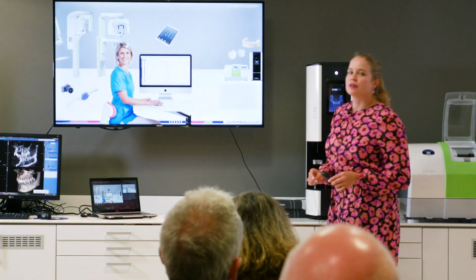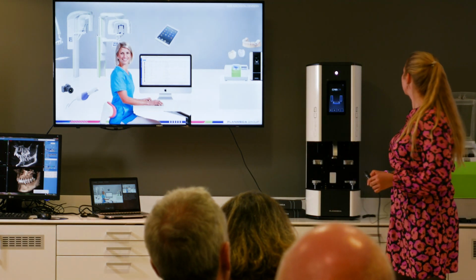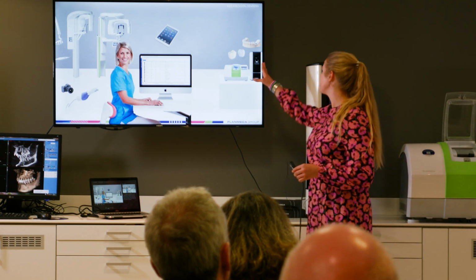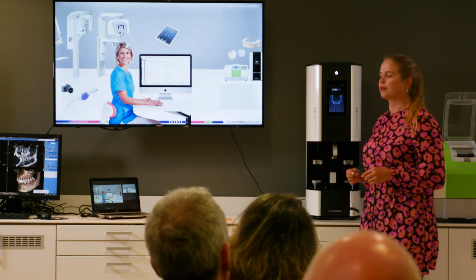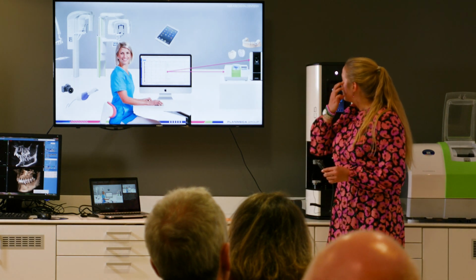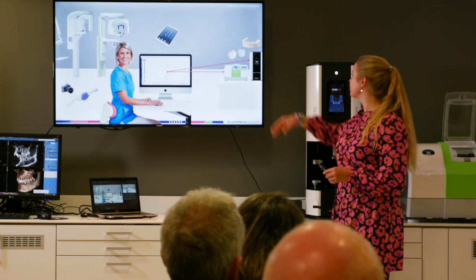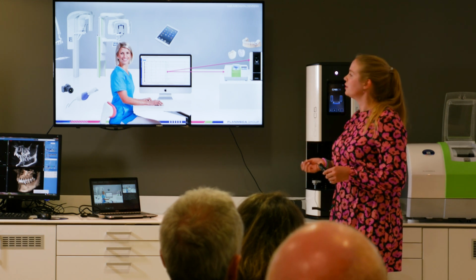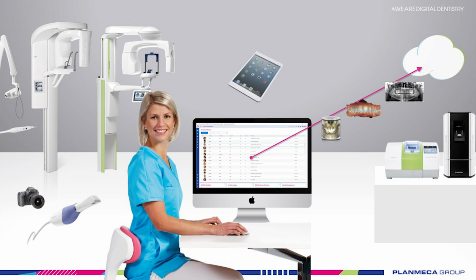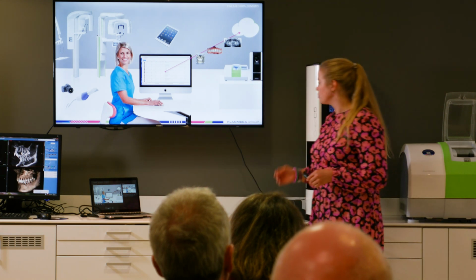And finally, let's complement our imaginary digital dentistry practice with, it's almost like what I have here behind me. So a milling machine for producing restorations, and a 3D printer with which we could print out surgical guides, surgical splints, and dental models. So from Romexis, we can send data to these devices or to other devices. From Romexis, we can get everything out in the standard STL format. So if we have a printer or milling machine ourselves, we could produce them in-house, or then another option is always to send them out of Romexis, for example, using our cloud transfer, or just sending them in some other way in STL format from Romexis to be manufactured elsewhere.